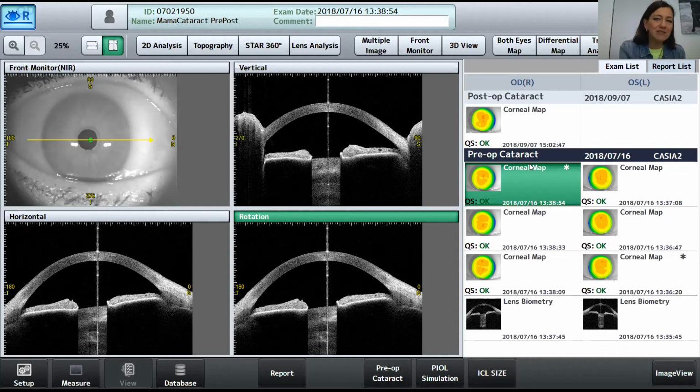We talked a lot about preset scans already for the cataract surgery, for glaucoma, and so on. We have different default exams that we are using. We have a global scan with 128 scans and so on. But especially in the glaucoma section and also some other specialized surgeries, you eventually need a higher resolution, or you need a smaller field you are scanning in the periphery, for example, if you want to scan any kind of stent that you have implanted.